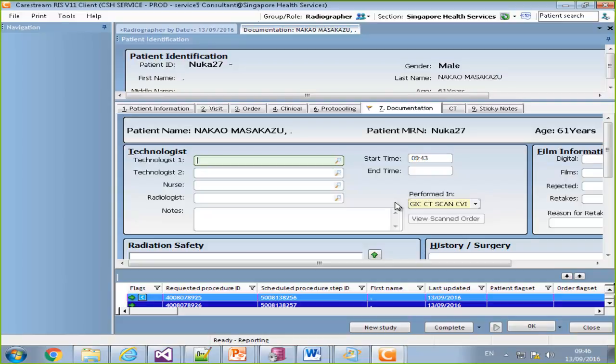This is why the main study is important, so we know which study we're copying from. On this control, it means that the value that we enter in each control will be copied to the other PPS.